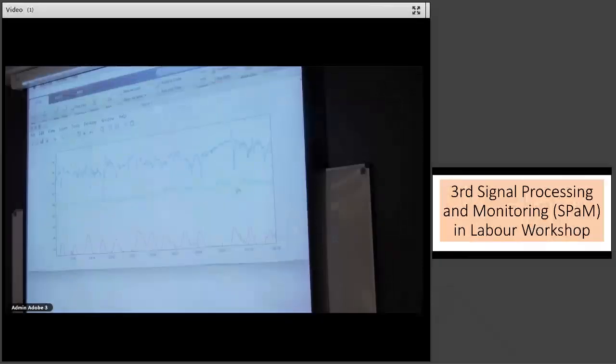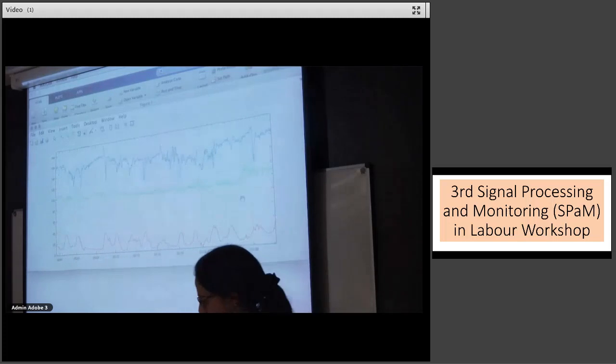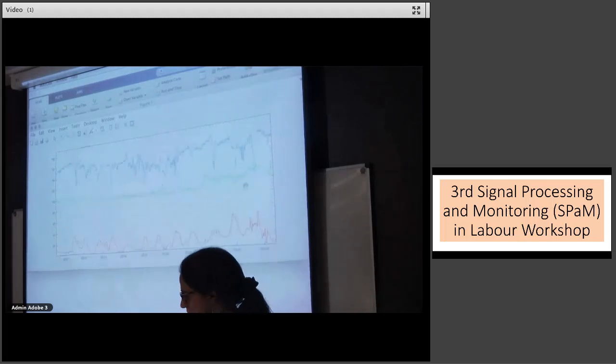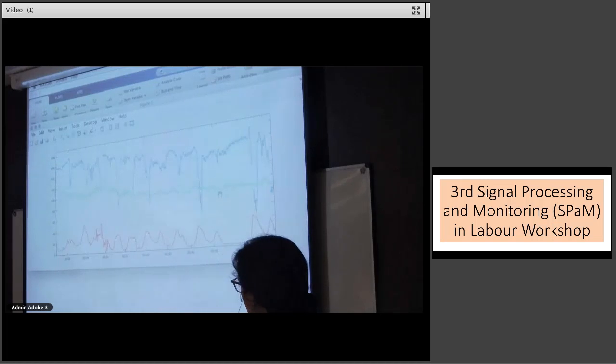Now there are definitely too many contractions, because they're about 5 in 10 minutes, or maybe a bit more. But notice the pattern, notice the rhythm of the contractions. Remember, the purpose and the objective of oxytocin stimulation is the dullest rhythm you can find. Absolute metronomic pacing of the uterus. Shorter intervals, longer intervals, that's already too much oxytocin. And the baseline's way up, 160.